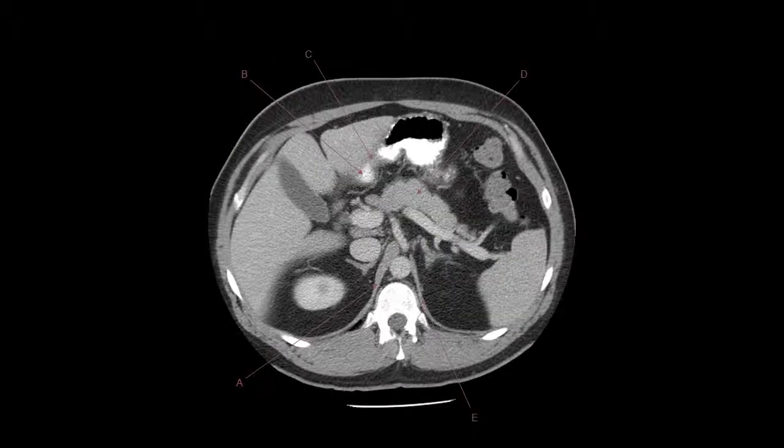All right, what do we have here? So just to note again, what's this? Gallbladder, right? Bottom of the liver. Real nice tubular structure. It usually shows up dark unless it has stones in it, and then you'll actually see some white stones pop in. Okay. You've still got your stomach here. What's this structure D? Starts over near the liver, and it's a little odd shape, and it runs toward the spleen. That would be your pancreas, right?